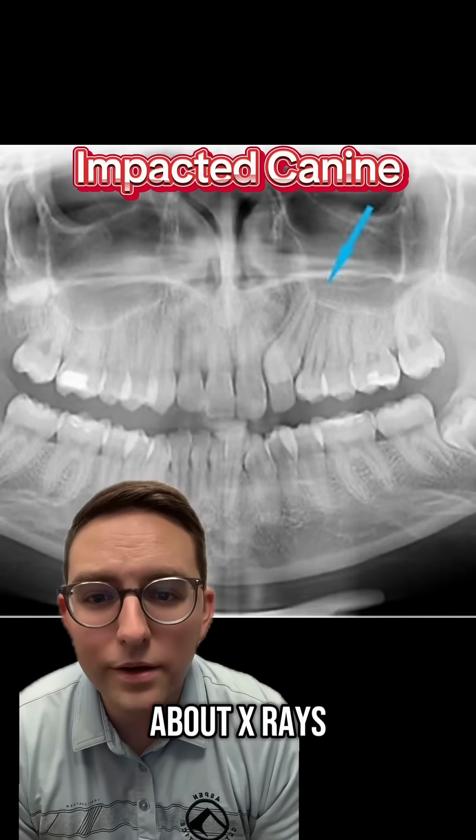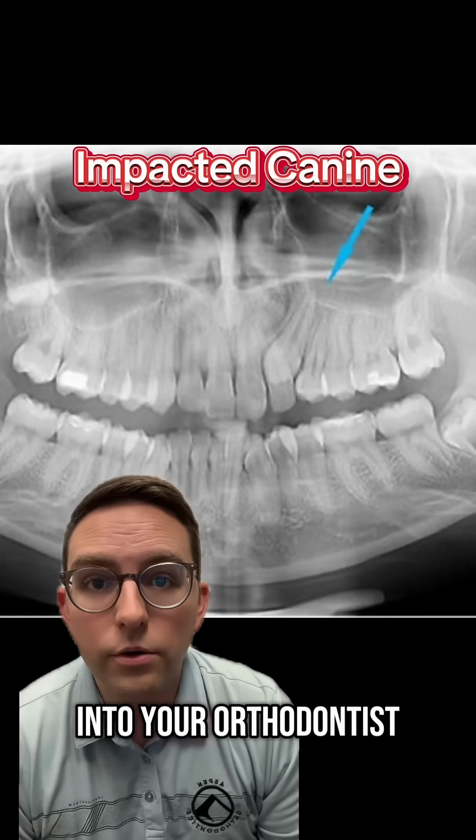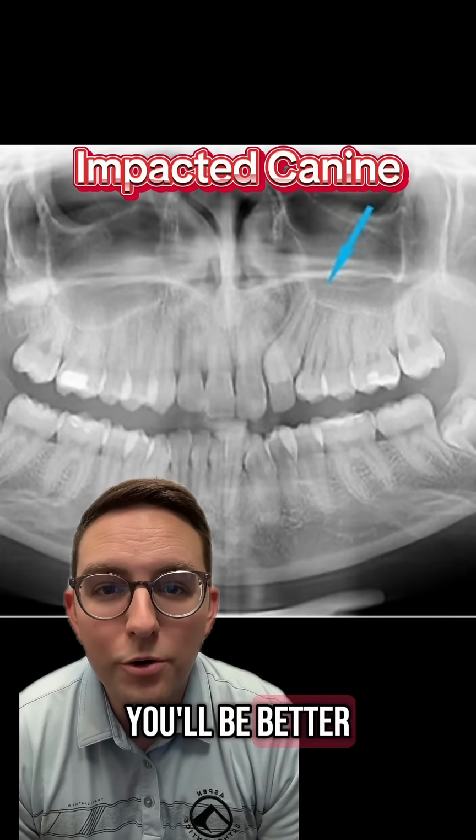So let's talk about x-rays and what your orthodontist is looking for. So you have an idea when you go into your orthodontist kind of what they're looking for, and if you have any issues, you'll be better equipped to handle them.